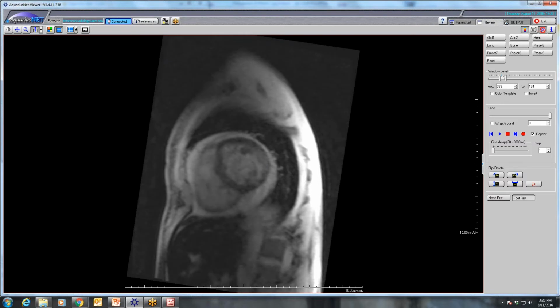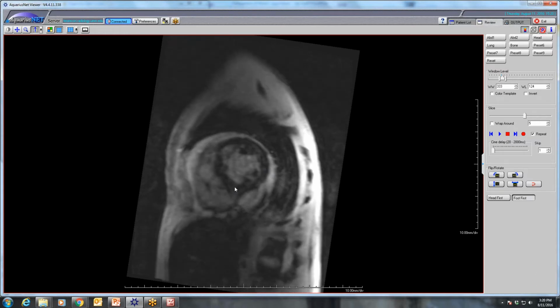And as you get a longer echo time, you get more dephasing of the T2 because of inherent inhomogeneities of the field. But with iron deposition, that becomes accentuated. And you can see very early on how rapidly this thing drops out. Looking at it qualitatively, this sure does look positive.